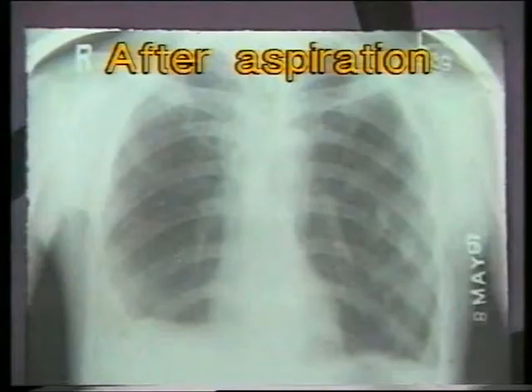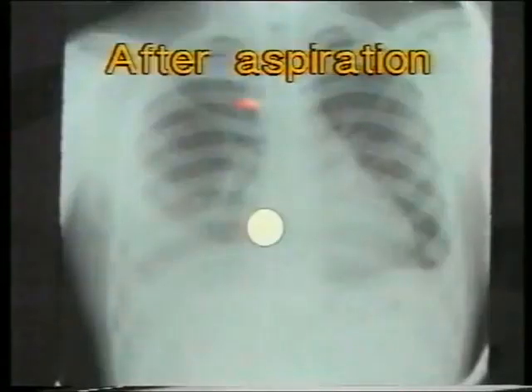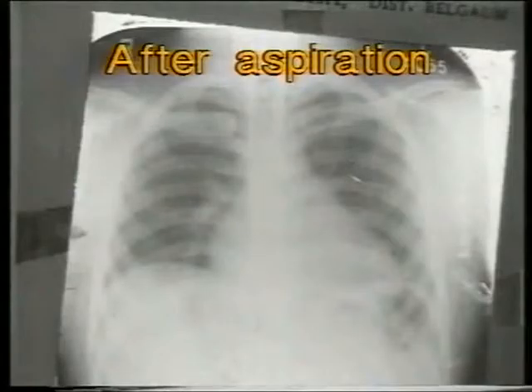And this second X-ray after aspiration shows that the fluid is removed, the lung has expanded, the costophrenic angle is clear, and there is a diffuse thin haziness in the right lower zone, which is due to the pleural reaction or inflammation. This is another set of X-rays before and after pleural fluid aspiration. Note the right pleural effusion. The second X-ray after fluid aspiration shows the pleural reaction as haziness in the right costophrenic angle. And the third X-ray after 2 months of chemotherapy shows a completely clear lung field.